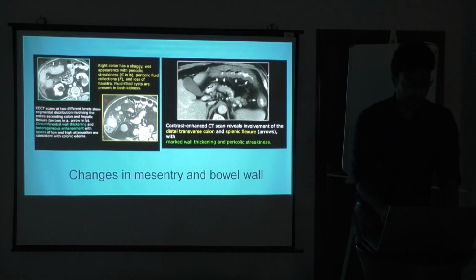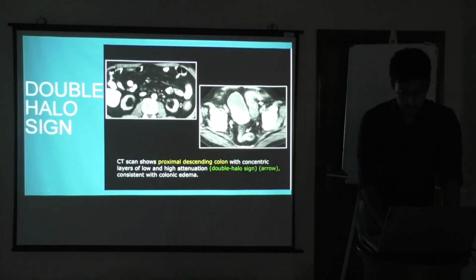I do understand it's quite difficult to pick up what is an inflamed bowel loop, how inflamed is it, is it going to ischemia. But this slide, this is where the importance comes. Simple, this is one of the typical signs of ischemia. You can see they have given the oral contrast.